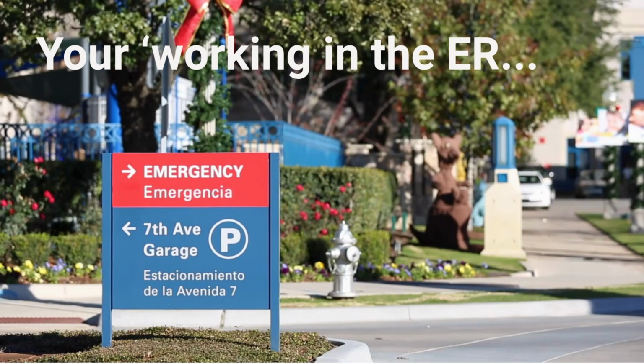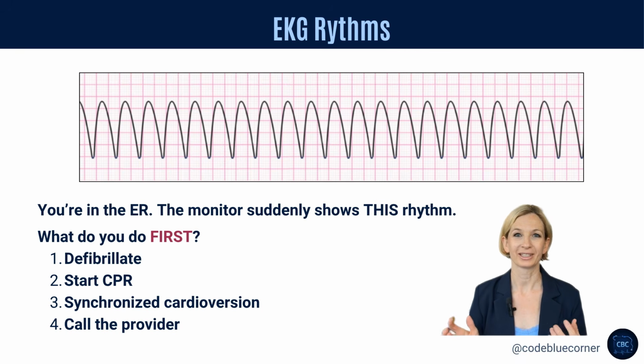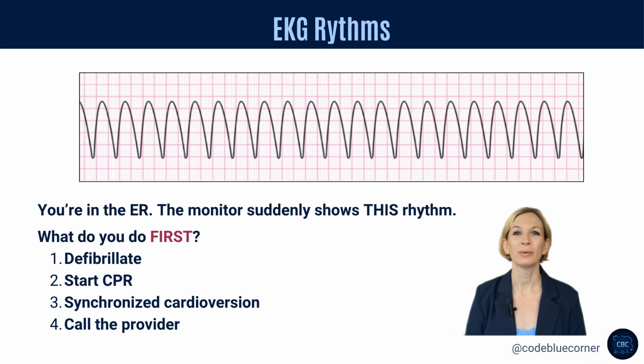You're working in the ER and your monitor suddenly shows this rhythm. What do you do first? Defibrillate, start CPR, synchronized cardioversion, or call the provider? Or do you need more information? Keep watching because by the end of this video, you'll know the first safest move every time.